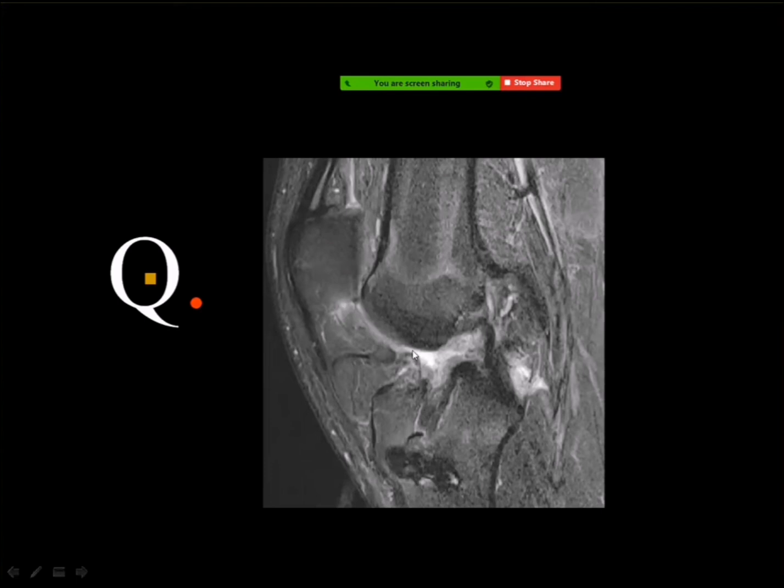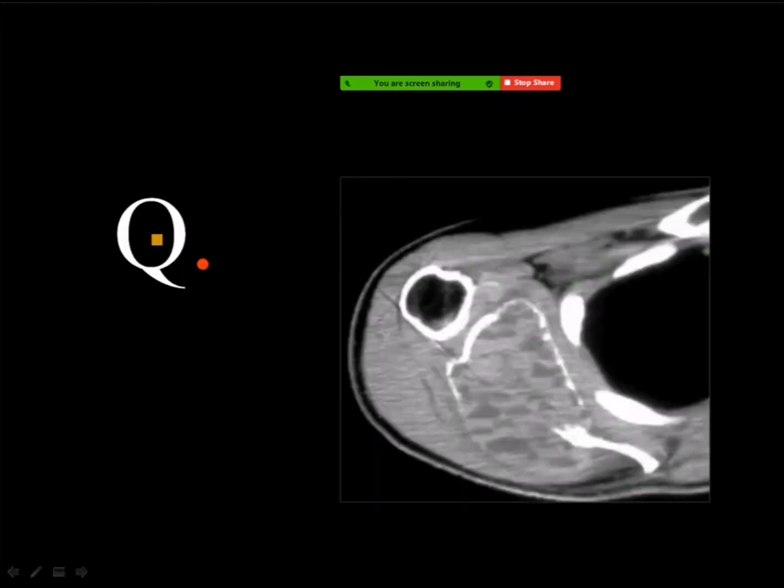And one of the good policies is to look in the anterior aspect of the knee for the cyclops lesion, which should be a very prominent mass of fibrous tissue. But this is fat in the infrapatellar fossa, and this is an ACL failed graft.